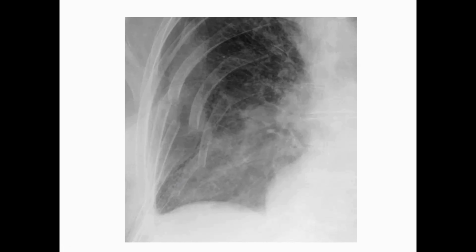So here, are we going to describe it as a consolidation of pneumonia? Is it a consolidation of pneumonia? No. Why? We will say this is a consolidation of contusion.